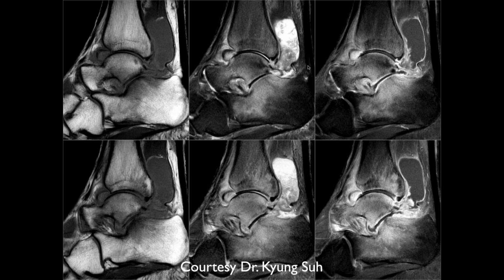You've got a large fluid collection here, and there are some erosions, but you're not seeing really gross destruction of the joint. If this were staph or strep, especially staph, and this has been around for months, you'd see much more destruction. And when you have these large, what are called cold abscesses, that really makes you think TB.